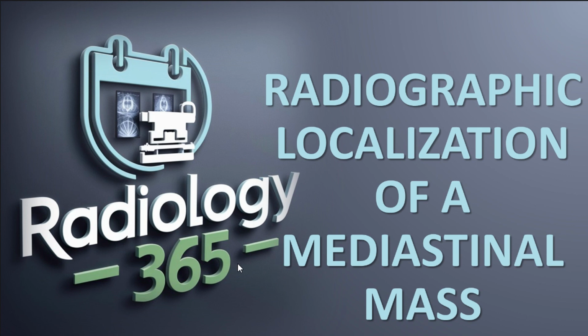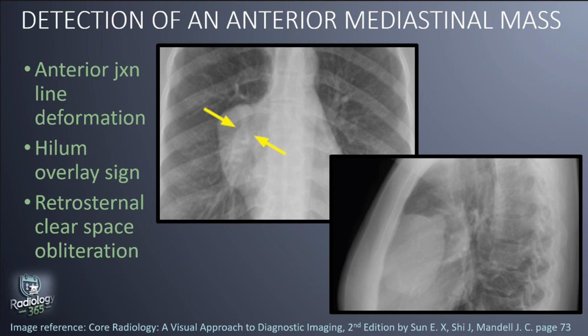Today we're going to be talking about the radiographic localization of a mediastinal mass, still continuing on our discussion on the mediastinum. We'll first start off with detection of an anterior mediastinal mass or a prevascular mediastinal mass. So the radiographic features we should be looking out for.